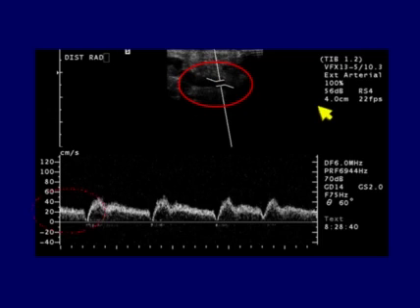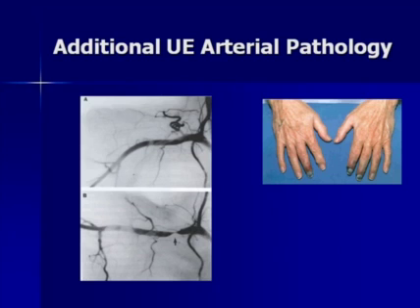So it should be a negative shift, but if we look over here, this is actually a positive shift. Even though it sort of looks like an arterial waveform, although a slightly strange one, it's a positive shift. So it's coming in this direction, from the hand back to the fistula, and that's a patient that needs that kind of problem addressed. Just a couple more slides now.